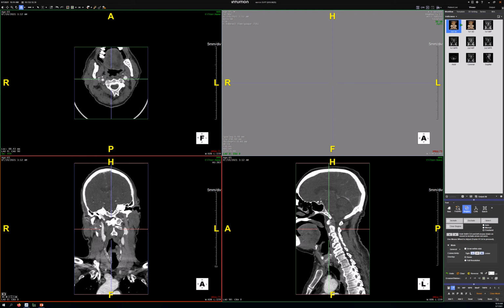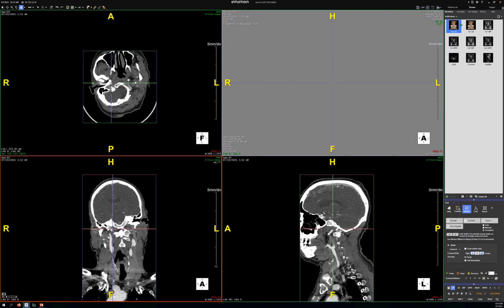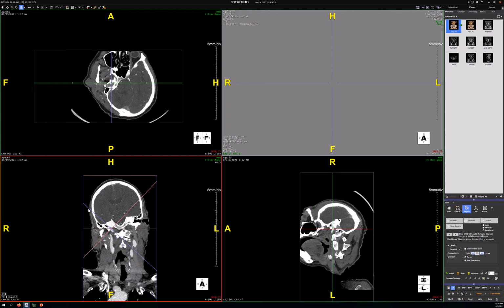Now, if you hold down the Alt key, you can localize on it. And then for me, manual segmentation always begins by obliquing. Hover over the little dot to turn it. There we go. Even though in almost every case people will move the axes by rotating, the default everywhere except the dot is to translate the axes. Maybe they should have done it differently, we can talk to them about that.